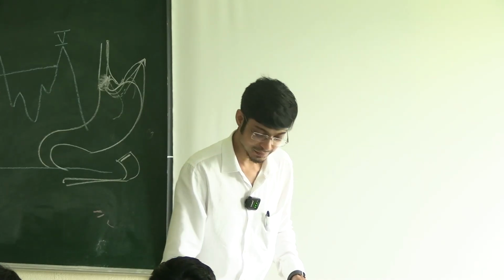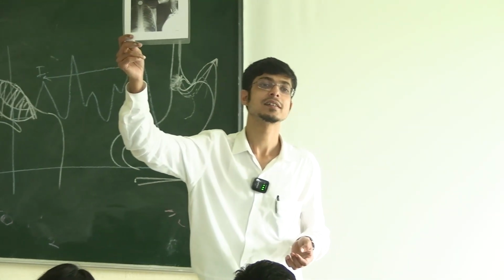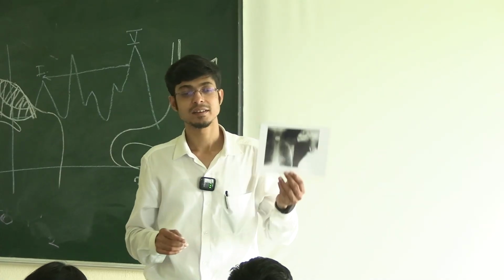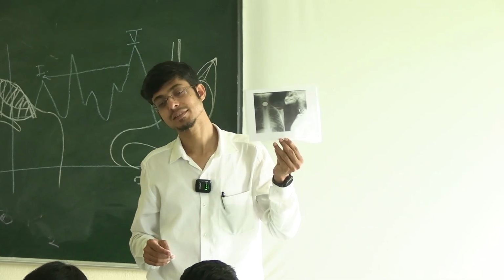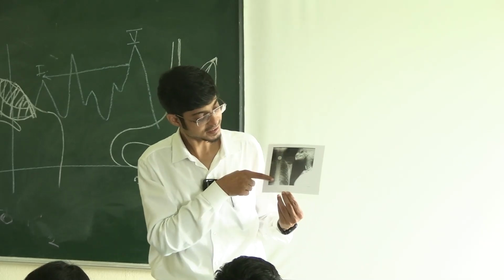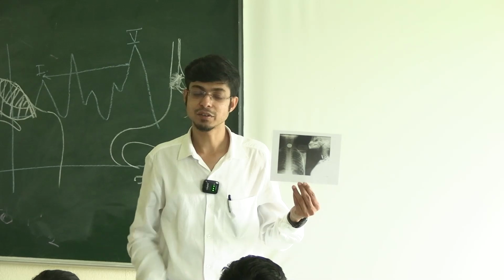So now we'll come to the famous X-ray. I think this is the only X-ray everyone could answer. A few were wrong, but most of them were right. So what is it? This is not how you say it. Tell me how you say it in the exam, because that's important. X-ray of neck, chest and upper part of the abdomen. Very good.